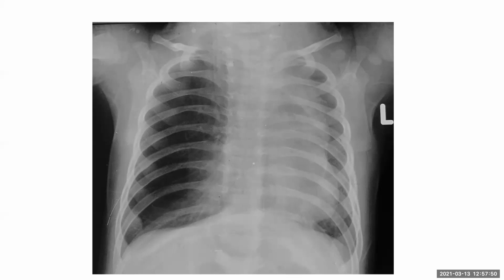So okay, let me interfere over here. If I tell you that this was your chest session going on, then redo your description. Just describe what you are seeing. I can appreciate that there is irregularity of the left chest ribs, and these are the posterior ribs. I can appreciate 1, 2, 3, 4, 5. Well, left 5th, 6th, and 7th ribs are slightly irregular.